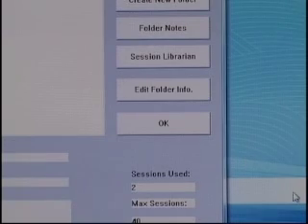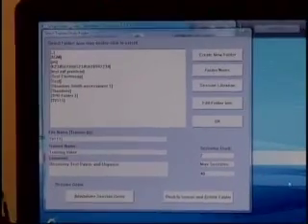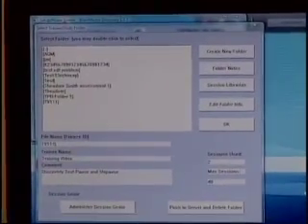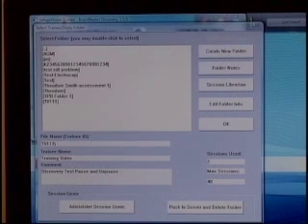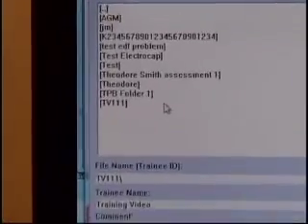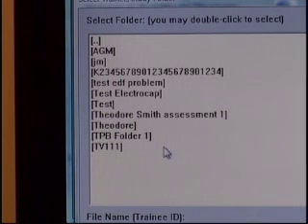One other thing I might want to do is to copy all this information to another computer, which would be a server, and to erase it from the local disk to keep this local machine clean. As you can see, we don't have a lot of files here, and the reason for that has been that we do tend to keep our files on a secure server. So we will use our Session Genie to do that.